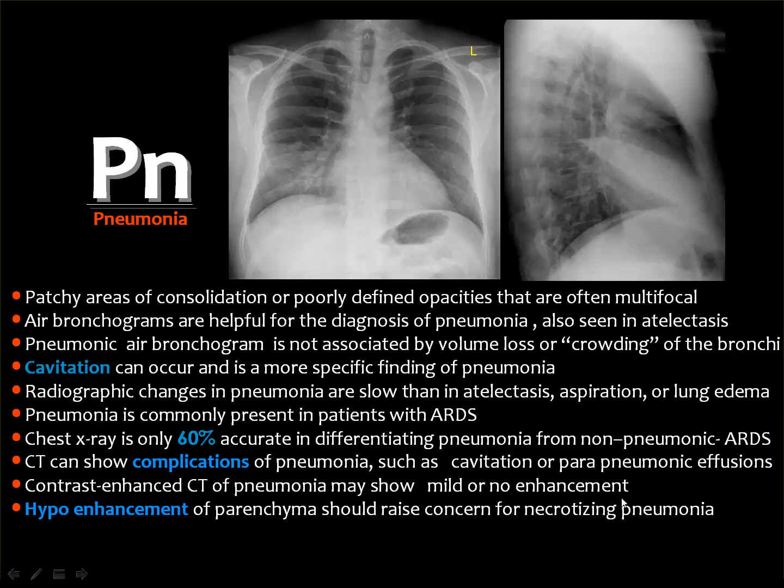Then pneumonia changes a little bit slower than atelectasis, aspiration and lung edema, meaning that the follow-up of a pulmonary opacity that is secondary to aspiration is rapidly changing compared to the opacity secondary to pneumonic consolidation.